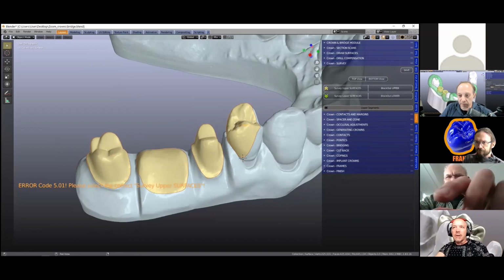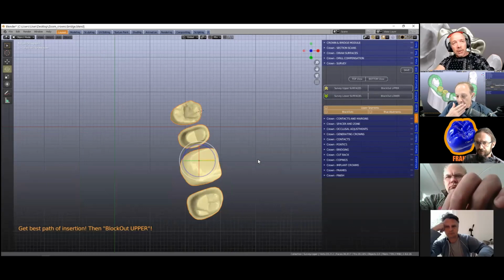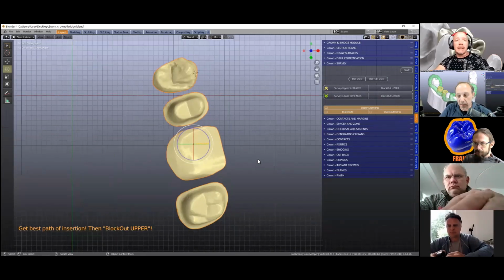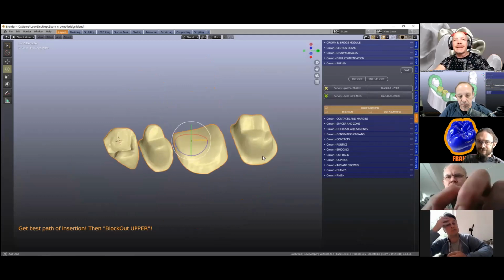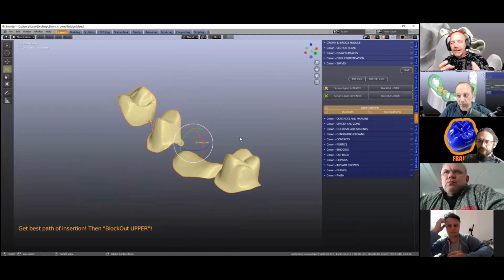So here we're going to then survey the top. This is something that we've shown 2 of our users how to do. They just don't get it, unfortunately. So what they're doing is they are surveying like this. Okay. Now there's a fundamental difference because what I'm doing is I'm moving the scene. And that's what we are trying to do, we want to rotate these surfaces, okay?